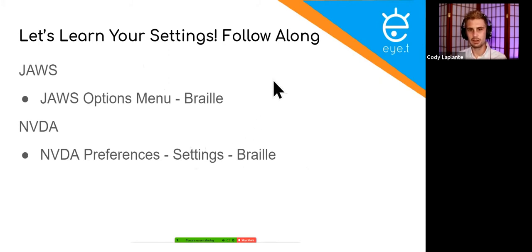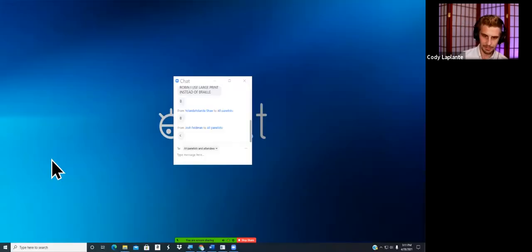Now let's learn your settings. So this is going to be a section where we follow along. If you're in the live section and you have a screen reader ready and open, you can follow along with me. If you're watching this recorded, you can also follow along and pause as you need to. So today I'm going to show you the options menu for Braille, I'm sorry, for JAWS. And I'm also going to show you the Braille settings for NVDA. So let me start with JAWS, okay? We just started doing that a little bit.